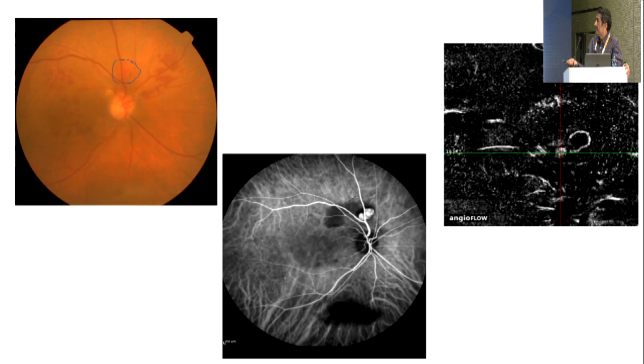This is one of our patients. You can see there's a subretinal polyp here. The ICG shows a bunch of polyps here, and one polyp is seen hyperflow. Hyperflow polyps are likely to respond better to treatment.